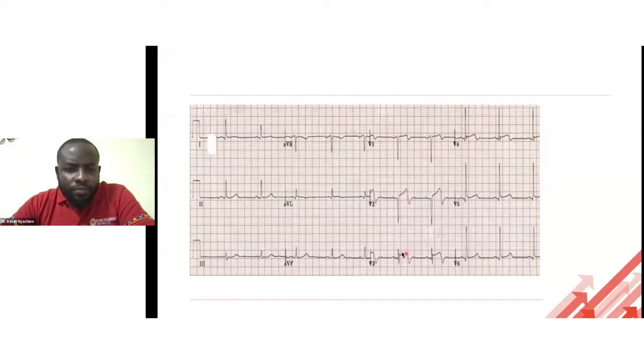Goes up, goes down, okay? T wave goes up, goes down, what we call biphasic T waves. Anybody have an idea what this is? It's a STEMI equivalent, okay? Somebody has an idea, okay? Wellens syndrome, good. So this is actually Wellens type A, okay?